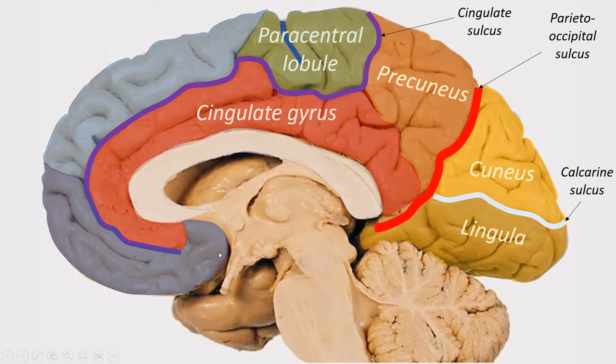Then let's move on to the frontal lobe, which is the only thing we still have to discuss. On the upper part, we have the superior frontal gyrus, and that's right, the same superior frontal gyrus we saw on the lateral surface, because it also extends along the medial plane.